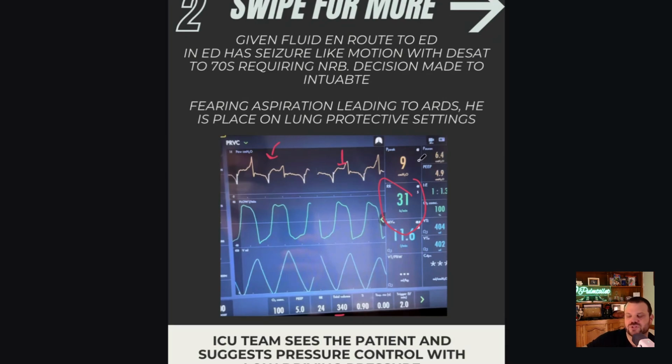So now the ventilator is barely doing anything at this point because the peak pressure is so low. And we didn't really intubate the patient for, let's say, a pulmonary issue. So they probably don't need a lot of inspiratory pressure to help them, but they're under a tremendous metabolic load for whatever reason. In this case, it could be DKA. There is no real answer to this because I just made it up, to be honest with you. But what I want you to start thinking about is it's not about solving the issue with the ventilator. It's about using the vent as your support as you fix whatever the condition is.